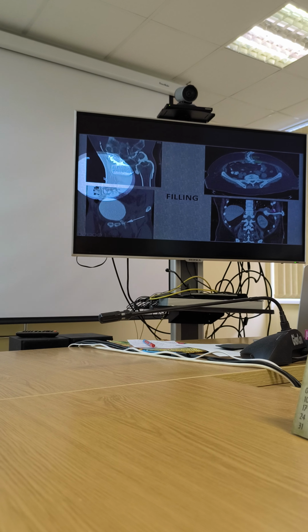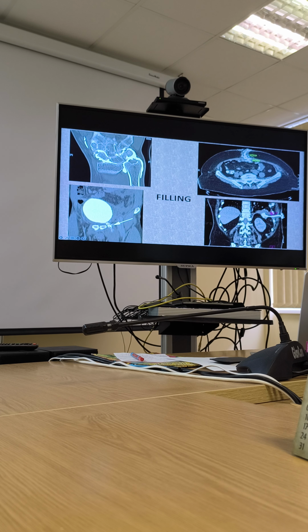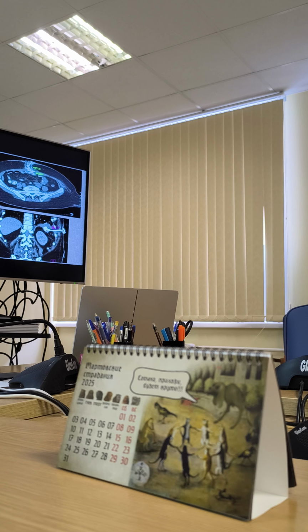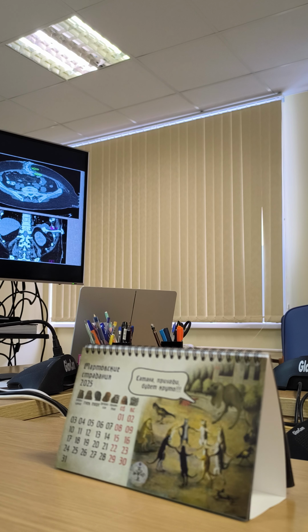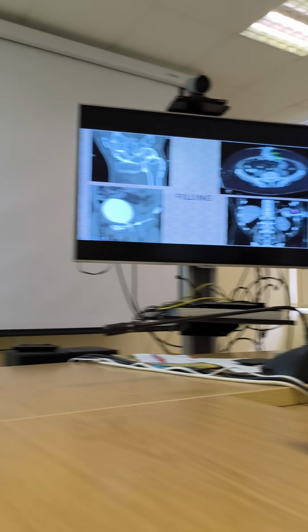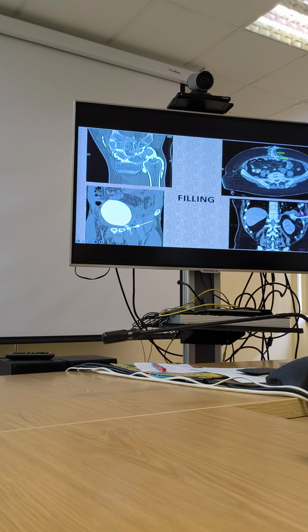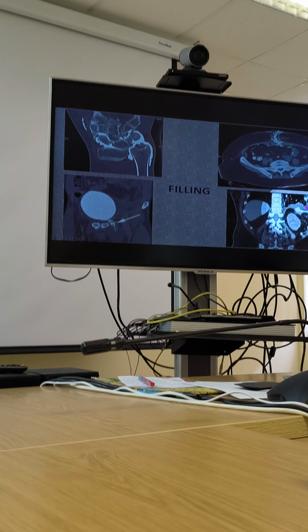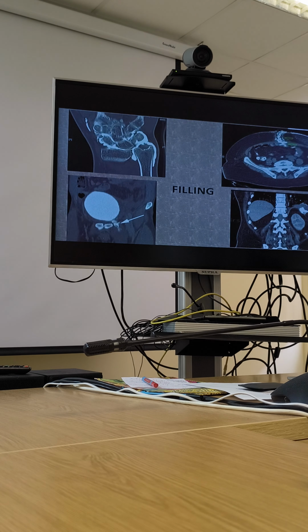What's this? Bone, femur. Yeah, it's CT arthrography. We are looking at a joint. And again, we see leaking, because the joint capsule is broken. Have any guesses? What's this? Vertebra.